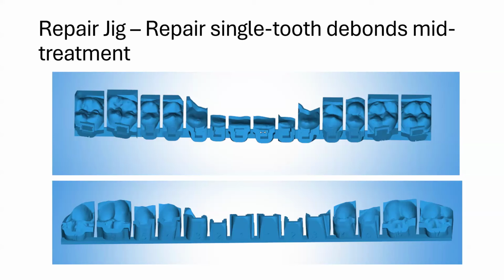It is interesting. The software will let you just take a bracket and hang it off the tooth a millimeter, basically putting a palatal step bend into the system. I don't do that. I do always have some metal touching the tooth. So there are cases where, being a semi-custom setup, it's not as ideal as I would want it to be, but I do like knowing the compromises I'm making from the beginning.